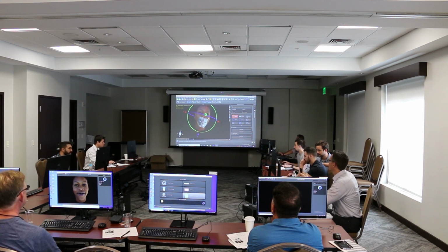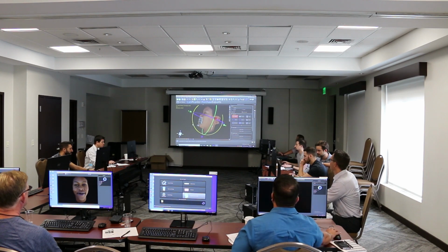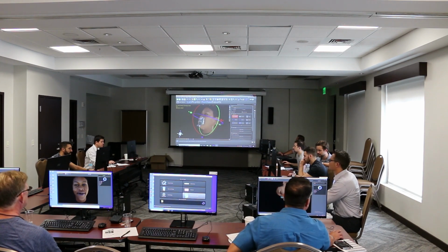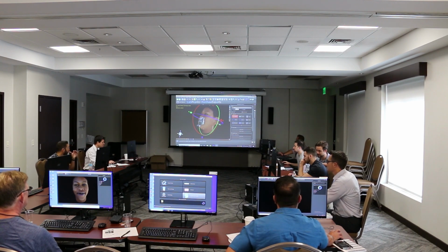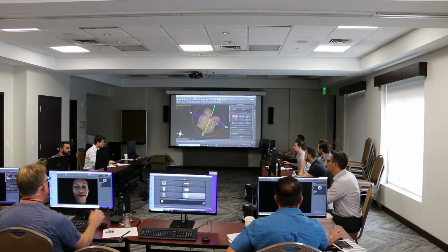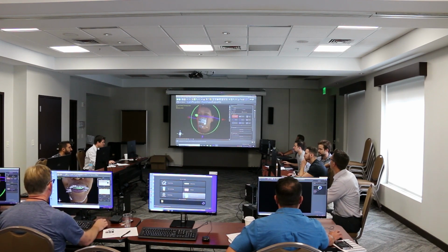All I have is her nose. And you can move it around. And this is where you can tweak your alignment. Where are you doing this? So I'm in model editing, and go to the model manipulation panel. Then select your head 3D, your face, and then click manual alignment. It's just like doing the teeth again.